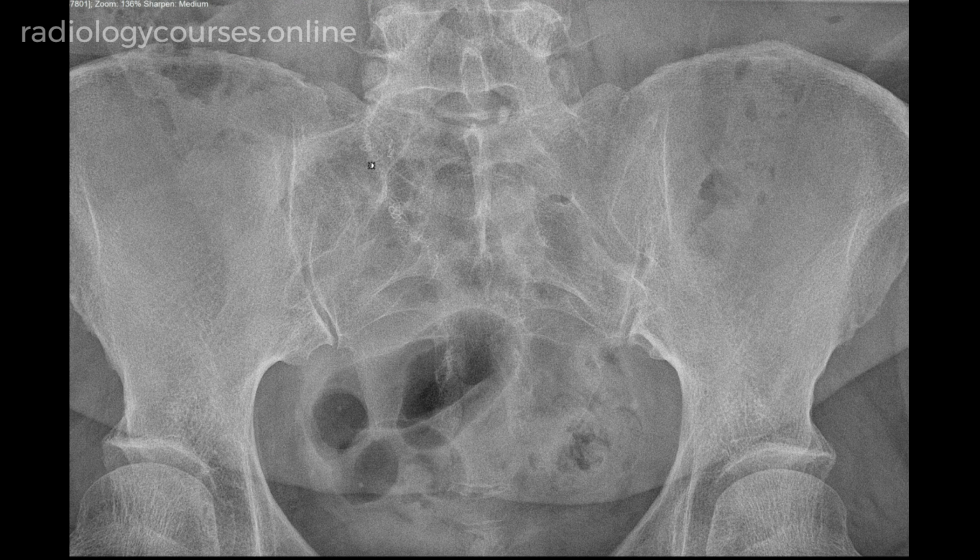But the lesson here is that we should not mistake this curvilinear abnormality for something pathological within the abdominal cavity or in the right sacral ala. And the other important thing about this X-ray is that we should not miss this subtle abnormality either, and we need to make sure it does not represent a true pathology and is purely a post-operative change.